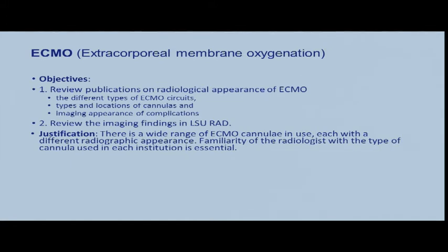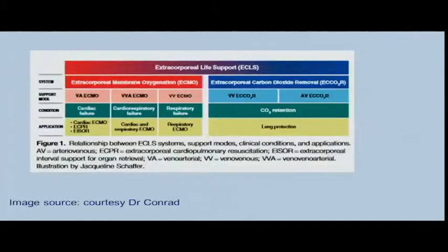Like he said, it is important for radiologists to familiarize themselves with the type of ECMO cannula that is used in their institution. And this sometimes is constantly changing. So even as they move to another one, we need to familiarize ourselves with the new device that is being used.